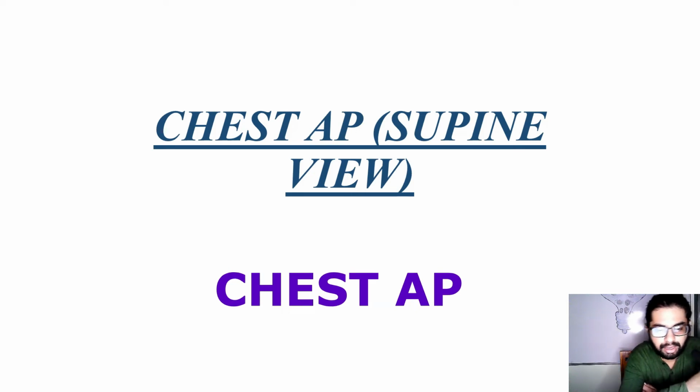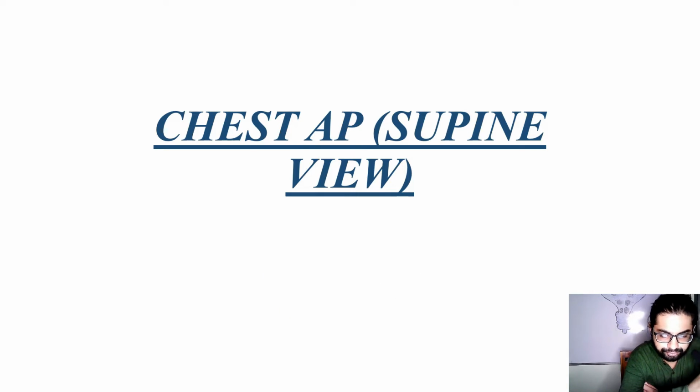Hi, in this video I will show how to read chest X-ray. The X-ray which is shown to you is the X-ray of the thorax or chest, anterior posterior view, and the person is in supine position.